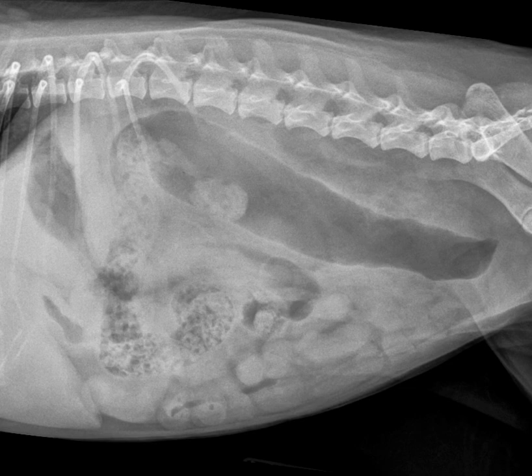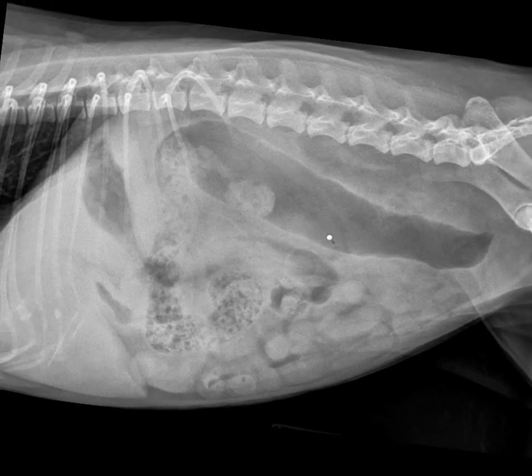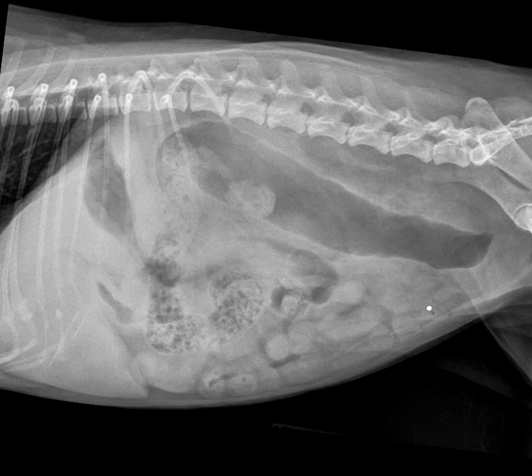What can we do next? I think the most important thing to do when we're sure that there's something abnormal like the retroperitoneal space in this patient is to pursue it with either sampling and/or additional imaging. Ultrasound can be a great way to look at the peritoneal and retroperitoneal spaces and may also allow you to confirm whether the gastric mural feature is real.